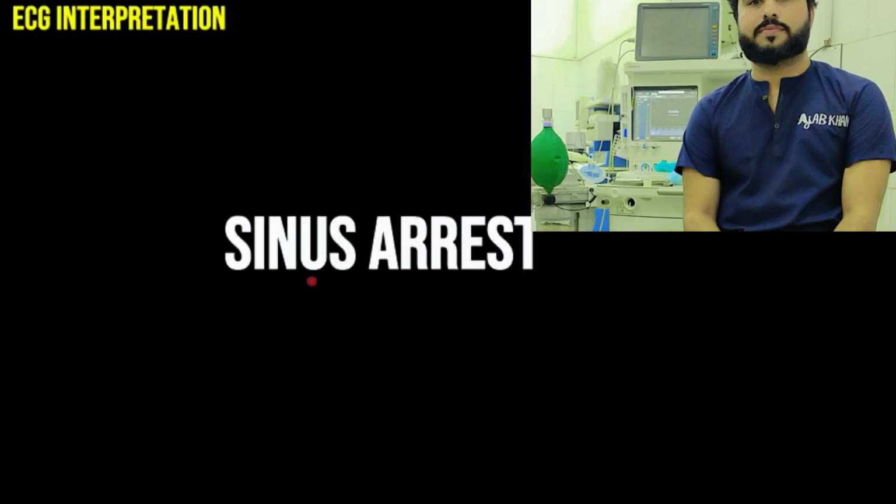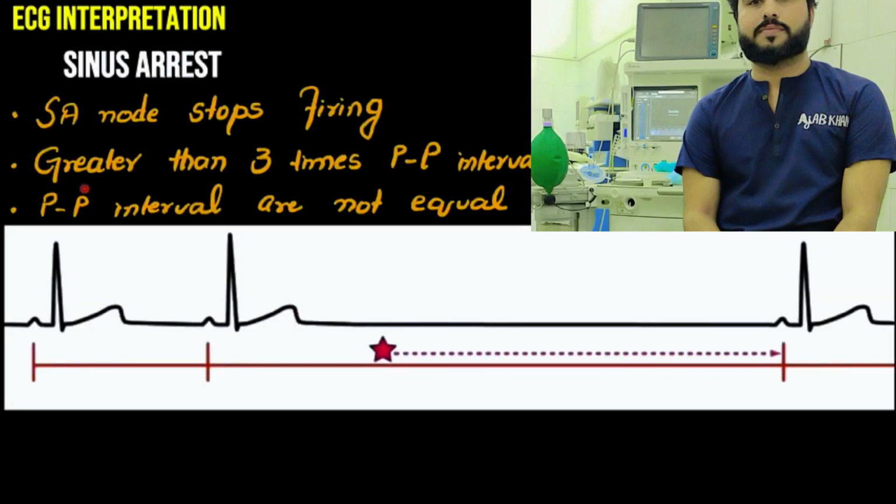Now coming to sinus arrest. Sinus arrest and sinus pause are almost the same. If a sinus pause is for greater than 3 P to P intervals, that is called a sinus arrest, where the SA node stops firing for a longer period of time. So the sinus pause which is greater than 3 times the P to P interval, where 3 beats have been missed, is called a sinus arrest, because this SA node has now arrested and 3 beats, or more than 3 beats, have been missed. That is called a sinus arrest.